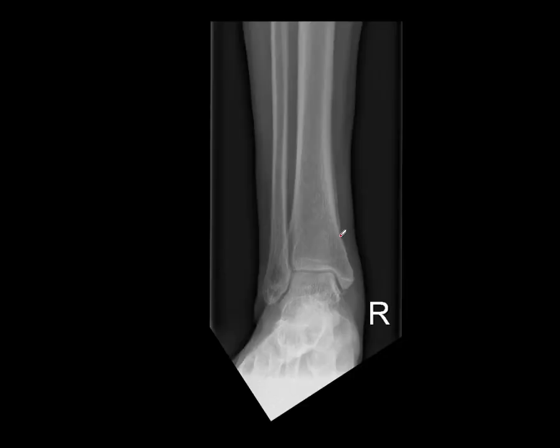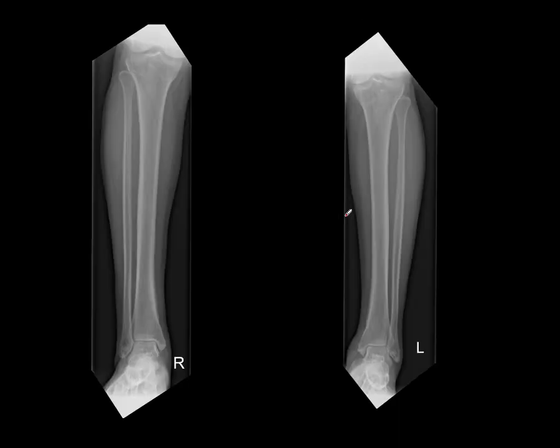Here's a couple more examples. Here's some hypertrophic pulmonary osteoarthropathy changes. Same patient. I'm just going to show you this picture here. You can see a little bit of prominent periosteal reaction in the interosseous membrane, and this is actually normal. Okay, you can see this normally. Same patient, but this is actually normal. You can see that periosteal reaction down here.